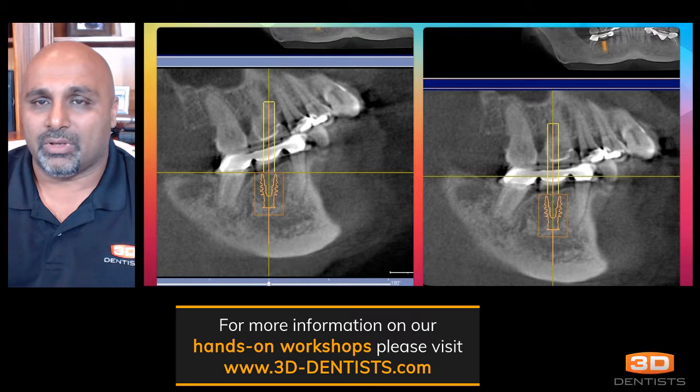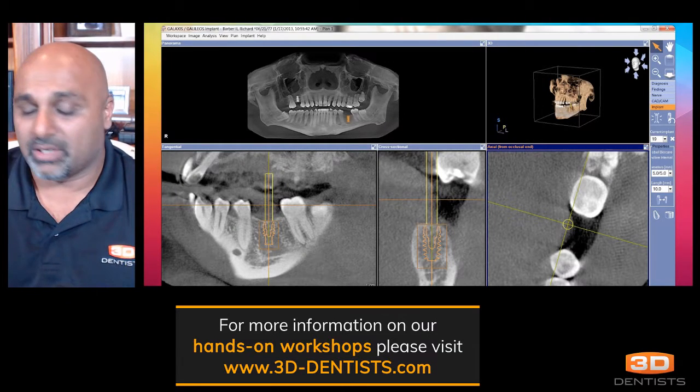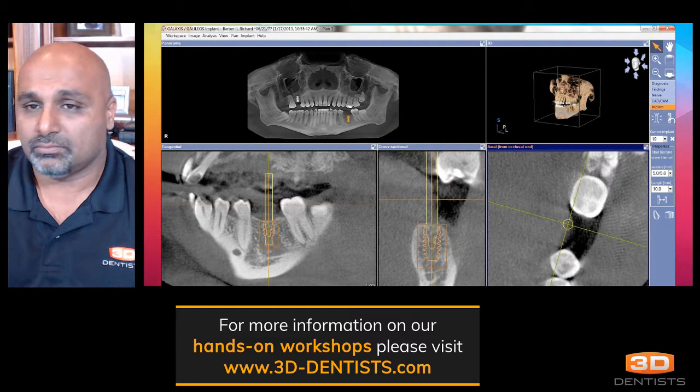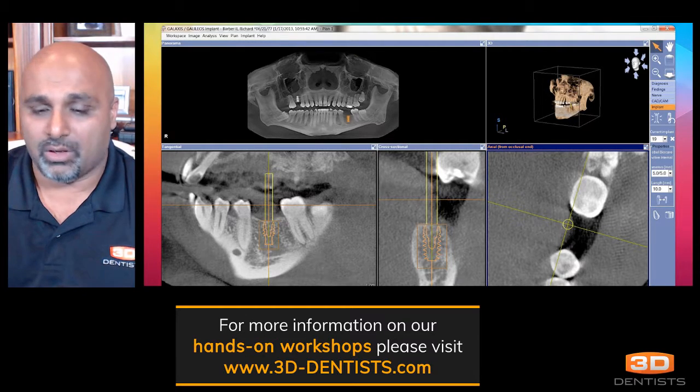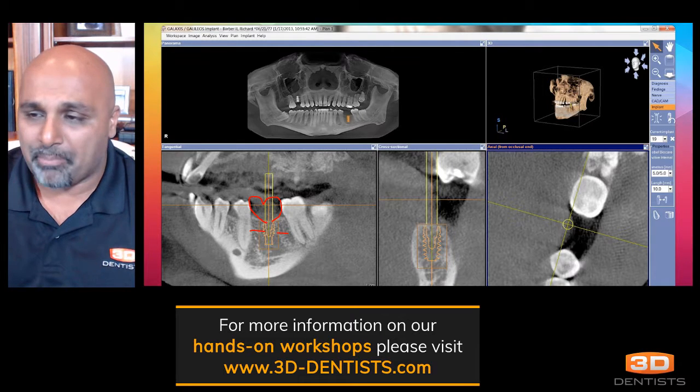So let's take a look at another one here. And now we'll take a look at this, and what we'll see again is we are relatively well centered here, centered like so. We've got a restoration, not bad of a food trap.